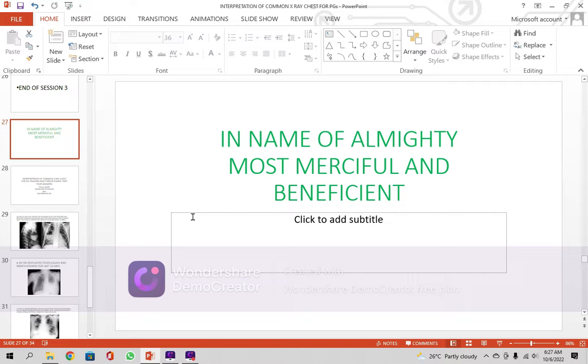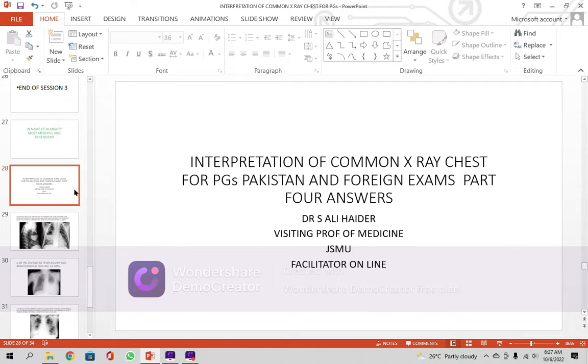In the name of Almighty, most merciful and beneficent, I have given you in part 4 the 5 plain chest X-rays, and they should be interpreted. Well, I think the answers which can be given by me, although I'm not a very expert person of this field. As a clinician, yes, I am.